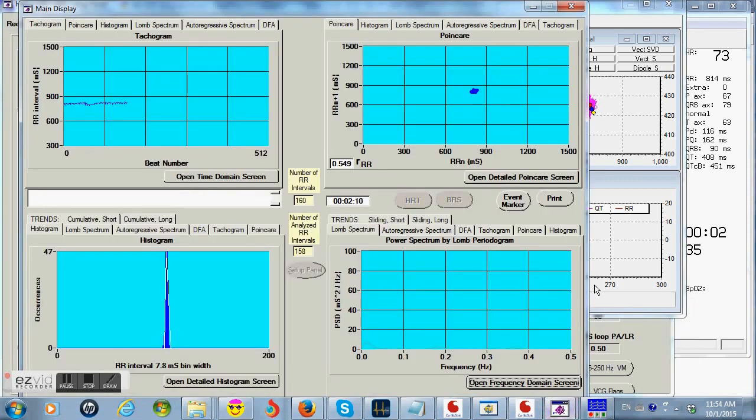Let's go on and let's look at RRV itself, and we can see again as it continues to run basically a flat line there in the tachygram. Usually a 50-some-year-old female should have a better RRV than that. Look at the histogram, looks kind of more like the Seattle Space Needle than anything else. You remember the healthy subject looked more like sort of an Egyptian step pyramid in that histogram. So we're seeing some abnormalities here.